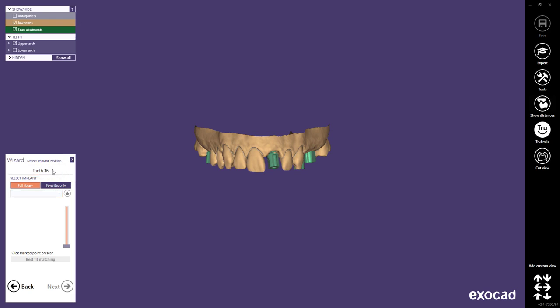To create implant models, you need the correct CAD library with the scan body used during scanning and an exactly matching model analog library, which contains the shape of the implant analog that will be placed in the model. Your reseller provides the software to you pre-configured with a working implant library setup.